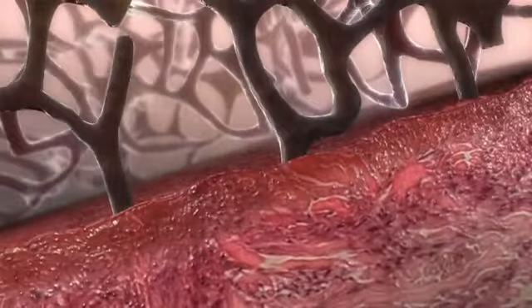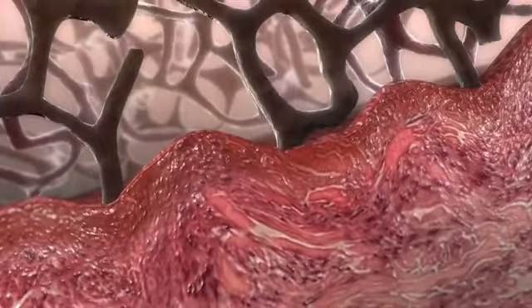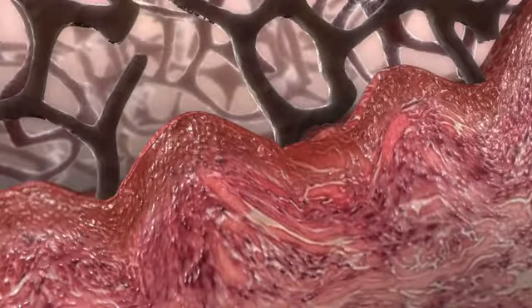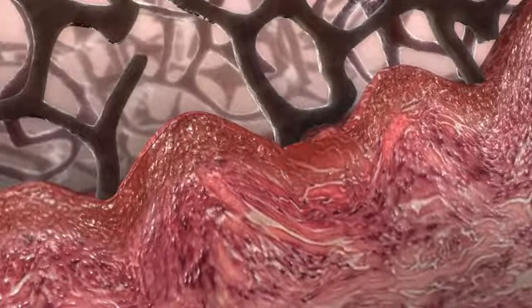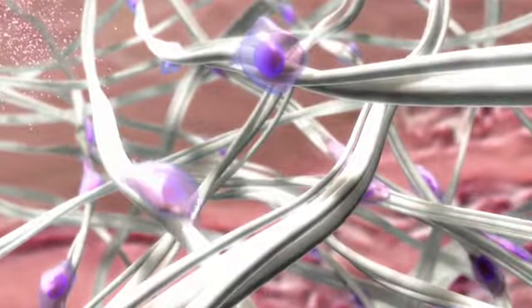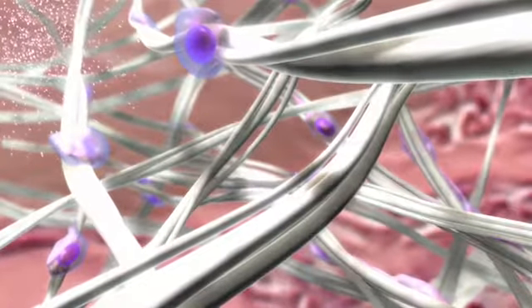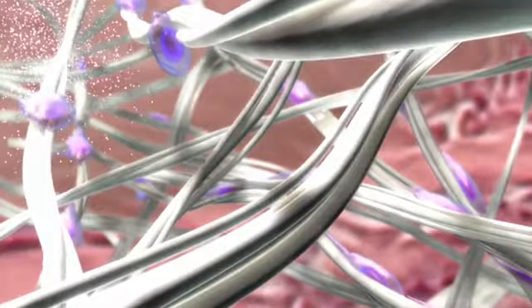The effects of the biological response are initiated by microstrain, which results from the manifolding of negative pressure across the proprietary GranuFoam dressing to the wound surface. This creates areas of cell surface strain, also called microdeformation. Tissue microdeformation at the cellular level leads to cell stretch. When cells of any kind are stretched, they are stimulated to expand, become thicker, and more metabolically active. This response to cells stretching has been well documented and is clinically used, for example, when tissue expanders are applied to stimulate the formation of new skin.